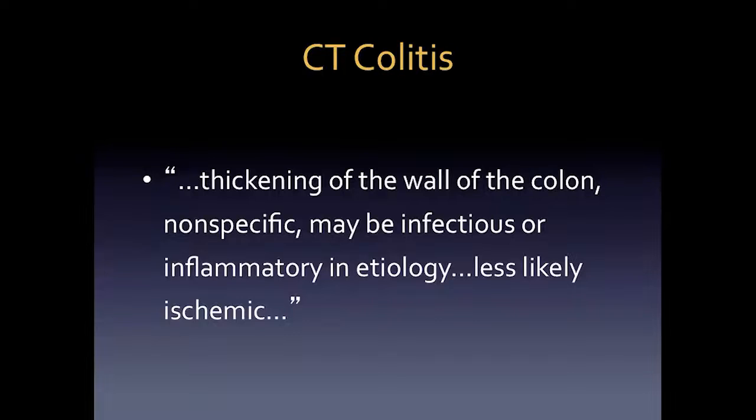So beginning with CT of colitis, I would ask you all if you have ever dictated something to the effect of there's thickening of the wall of the colon, which is nonspecific. It may be infectious or inflammatory in etiology, less likely ischemic. This is pretty common verbiage that we often put into our reports that reflects the fact that oftentimes when we make a diagnosis of colitis at CT, it is pretty nonspecific looking.